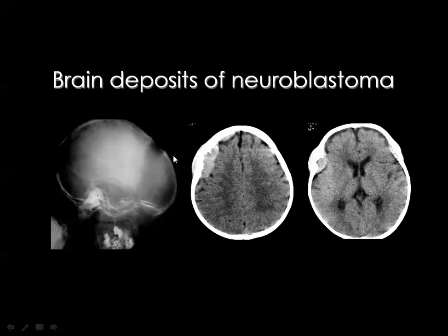It has an intracranial component, and many times it also has an extracranial component. And these lesions occur commonly near the orbital cavities, and they encroach significantly on the orbit, resulting in evident proptosis as well.